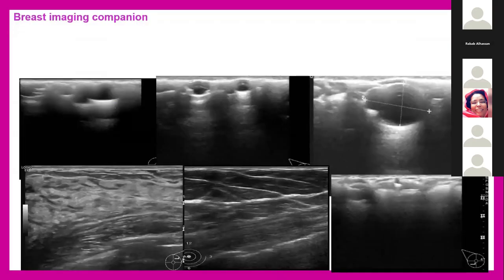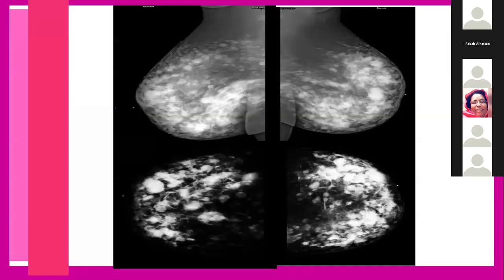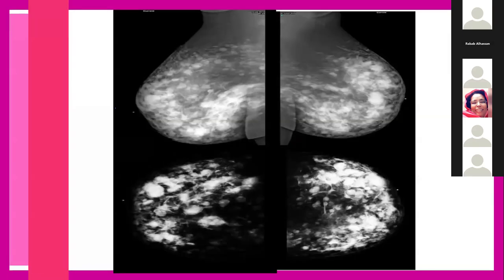This is the ultrasound. Have you seen such type of cases, Dr. Rabab? I saw it in the Gulf, honestly, because people used to go to Thailand to have this done. Yes. Got it. So this is free silicone injection. This is free silicone injection.